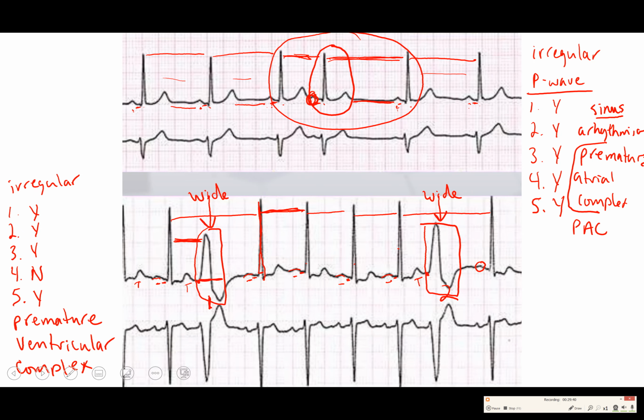They're actually sinus rhythms, right? If you take those premature beats out, everything else is normal sinus rhythm. Here what you're getting is sinus rhythm that's been interrupted by these premature complexes, either coming from the atria or coming from the ventricles. You can also get premature AV node or junctional complexes that look very similar to the PACs, except they don't have any P waves either.